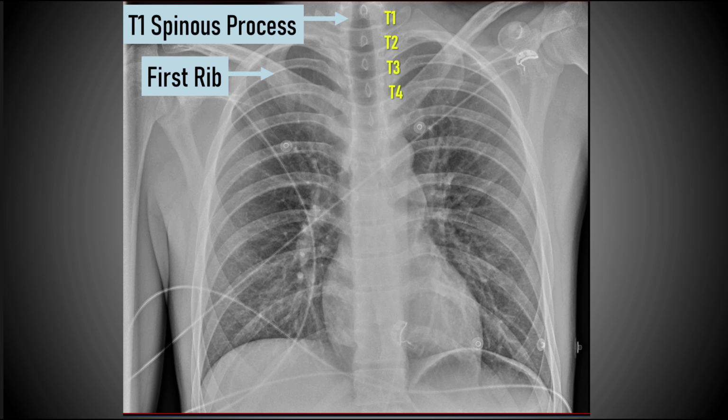In this particular image, you can see that because of the way it was taken, the clavicles dip downwards at a fairly steep angle. So if the tip of the tube was at T4 in this image, it would be above the level of the clavicles, but in the correct position.